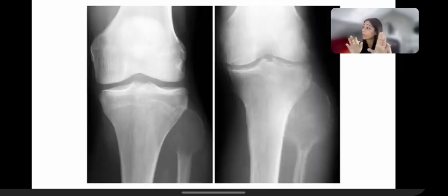Again, now there are two radiographs. Once again, quite similar radiology. On the left, you have this gentleman around 40 years of age with an expansile lucent lesion in the fibular head, which was a giant cell tumor.